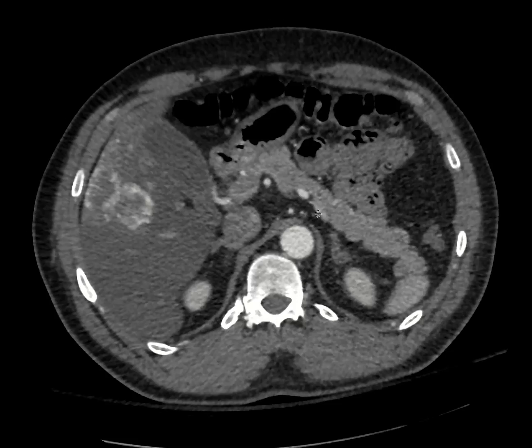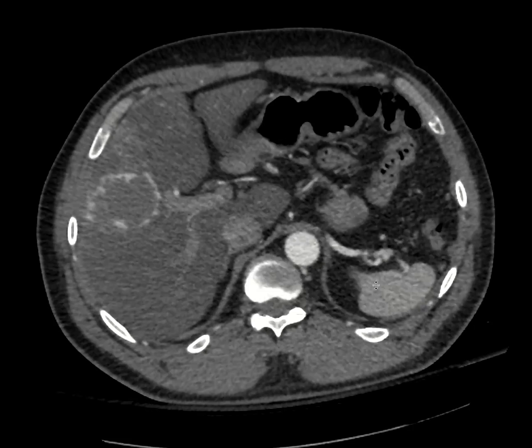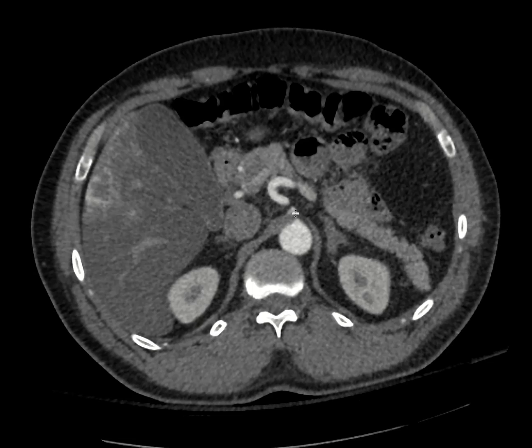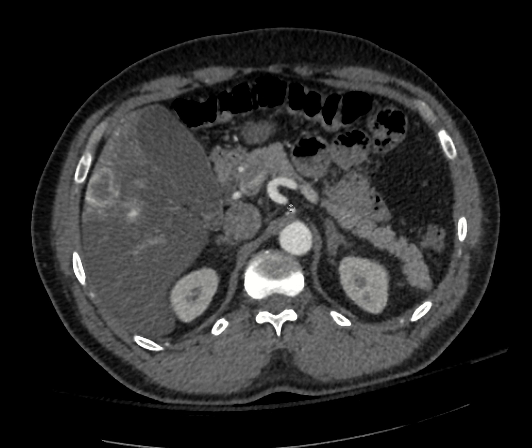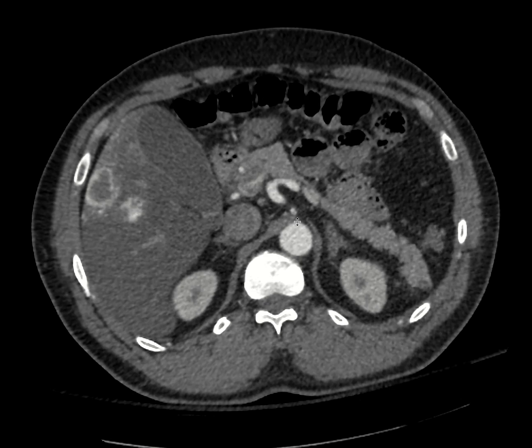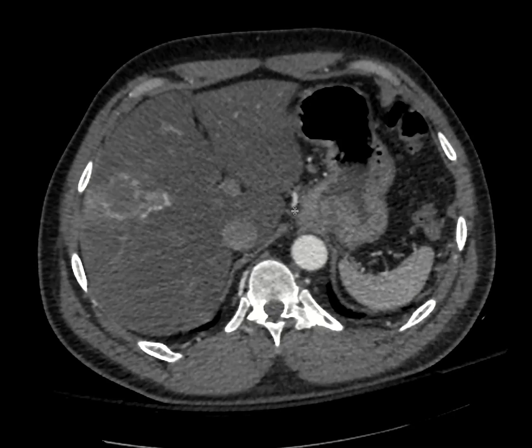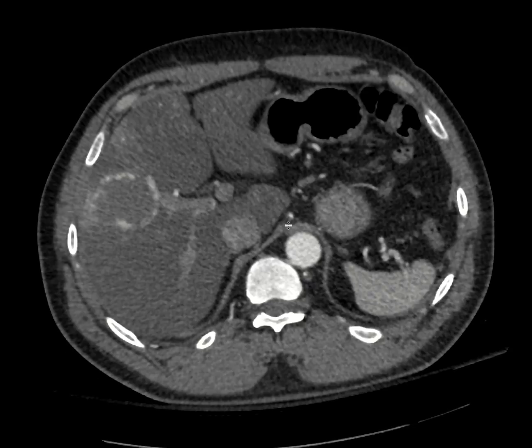That's the larger vessel that's coming here, posterior to the pancreas, heading over to the spleen. The second branch that often arises from the celiac is going to be the smaller one that we can see right here, and this is your left gastric artery. And so your left gastric artery comes up here and then goes into your gastrohepatic ligament.